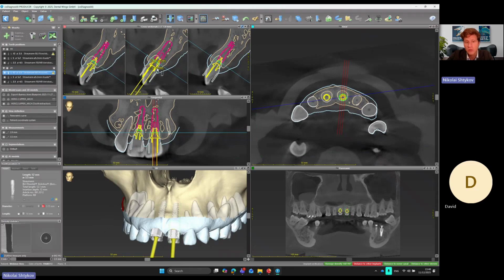We're still using 2.5 millimeters of the gingiva height of our abutment. And this part could be cuttable. It could be cut by the dental technician. And this is not a problem that this part intersects with the crown. So that's why I keep it here.